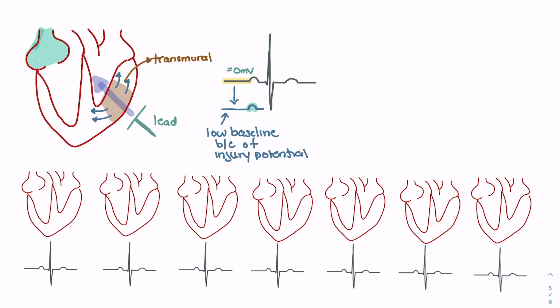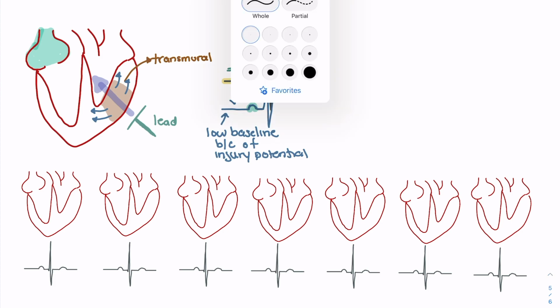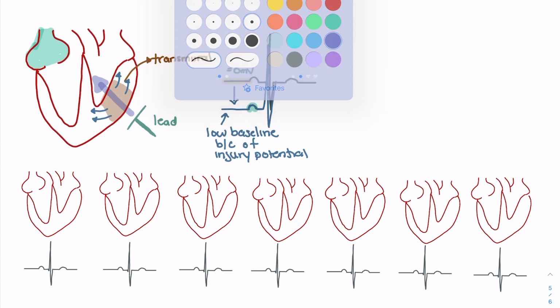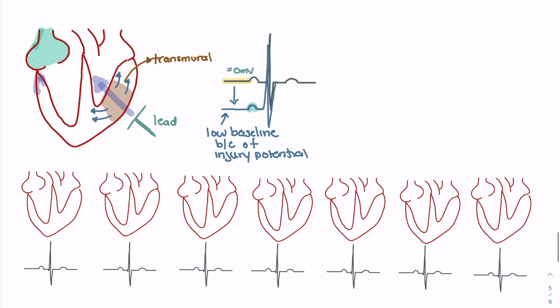The ventricle will then have its depolarization, so we get our normal ventricular depolarization and atrial repolarization, as it was described before. So the ventricle is going to depolarize, and this is where we start to see changes to the ST segment. The QRS complex will look as it does.